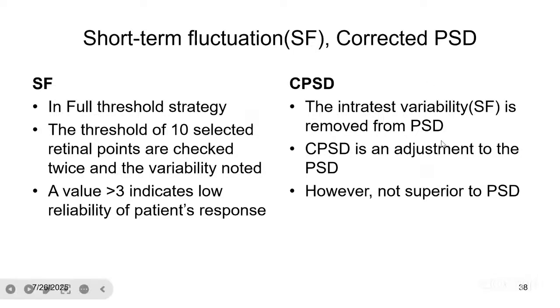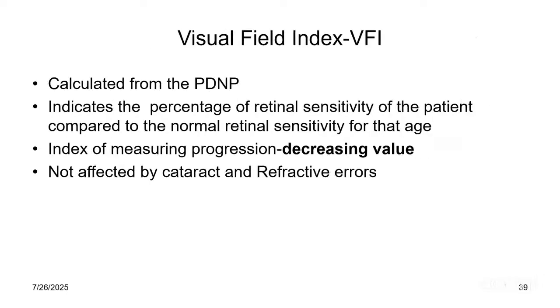So for corrected pattern standard deviation, this is usually done by removing the short-term fluctuation from the pattern standard deviation, and that gives the corrected pattern standard deviation. However, it's not superior to PSD.